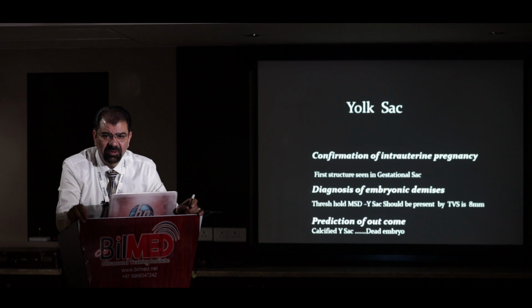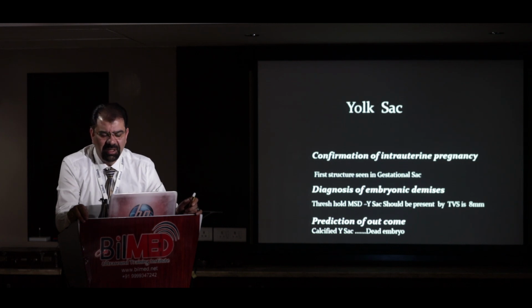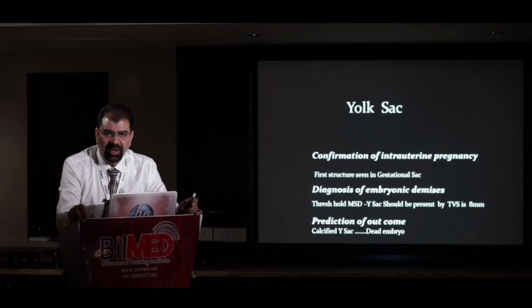And if the fetus is live today, there are high possibilities that it will be no more live tomorrow or a day after tomorrow. And in most cases, if not all, a severely calcified yolk sac will be a dead fetus today only.